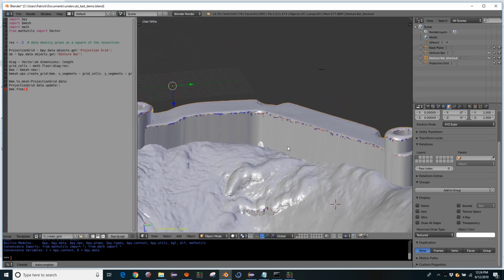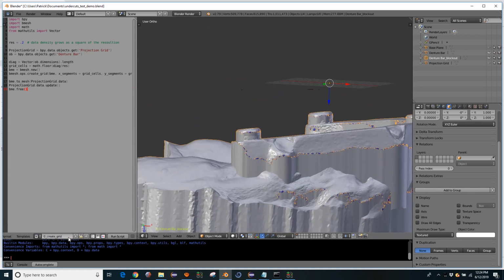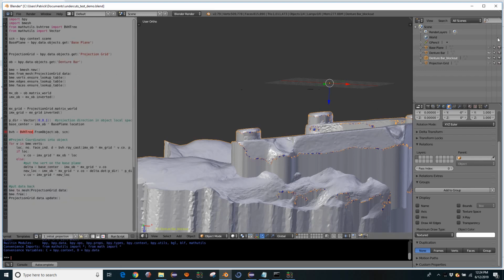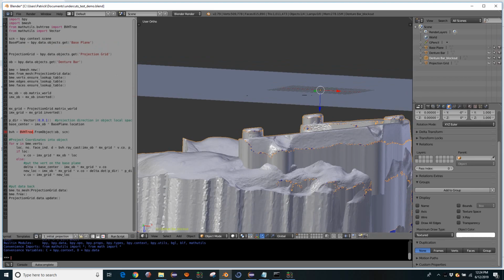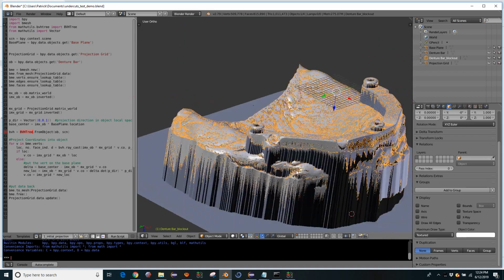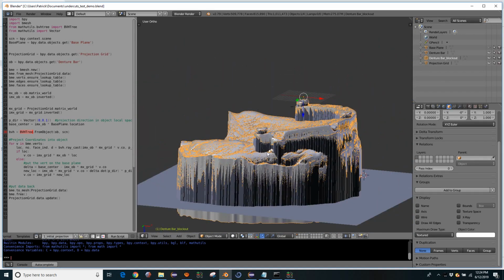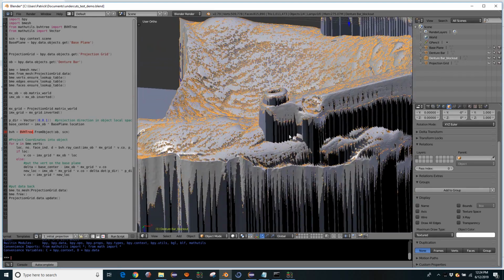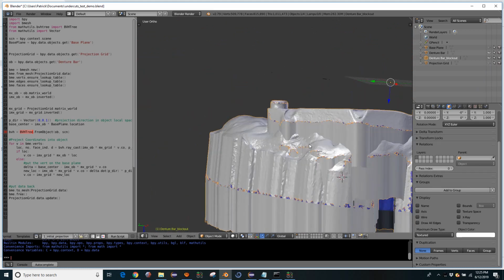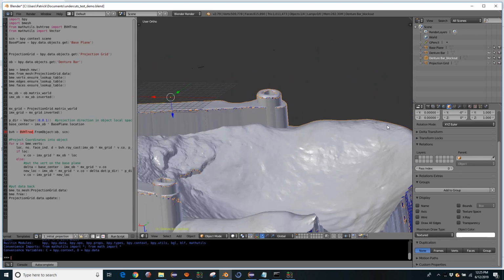If you look there, I mean, the precision of that compared to our projection grid is just far and away much better. And I guess we could, if we were good scientists, we could quantify how much better. Okay, so that is what I would call brute force undercut detection and removal.